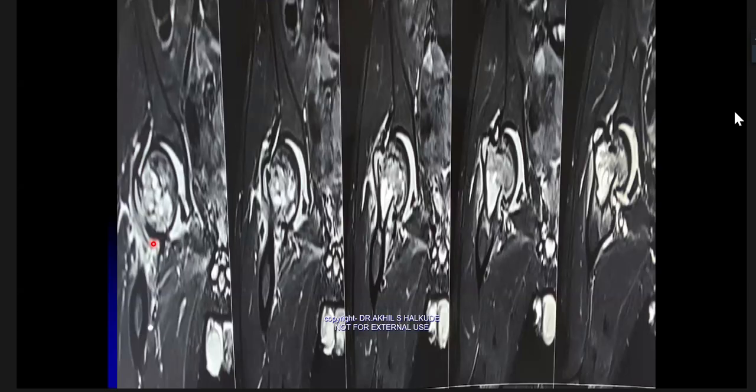My differential diagnosis is, sir, GCT with secondary ABC changes, or osteoblastoma with secondary ABC changes. Osteoblastoma, what is the most important feature of an osteoblastoma lesion? Does it occur in an immature skeleton? What is the age? What are the locations? Does it have a periosteal reaction? No, sir. Okay. Second DD.